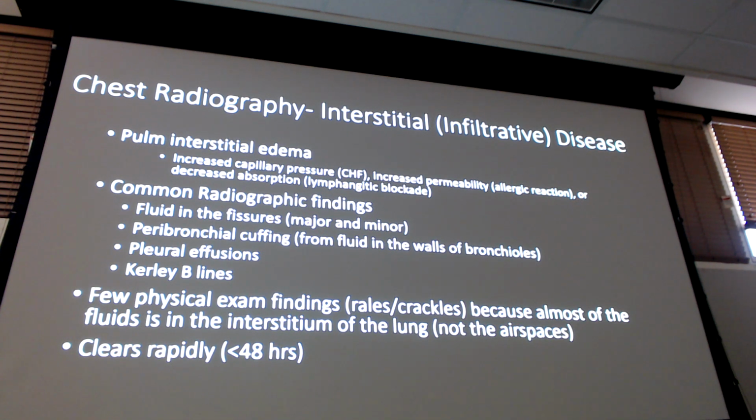I just need you to know that CHF is an infiltrating disease, and you can have all of those CHF findings on an X-ray with somebody who's not having congestive heart failure, because they don't have any of those other comorbidities or disease processes that lead to congestive heart failure. So if you're wondering why you're seeing this stuff in this 24-year-old healthy person who's just been a little bit sick, but I don't see the pneumonia or anything on the x-ray, it's not congestive heart failure.